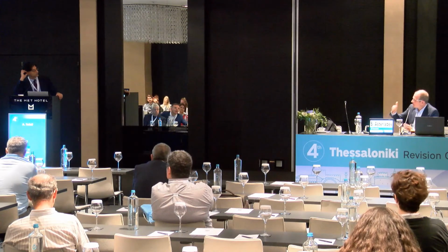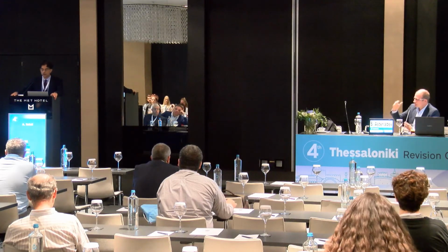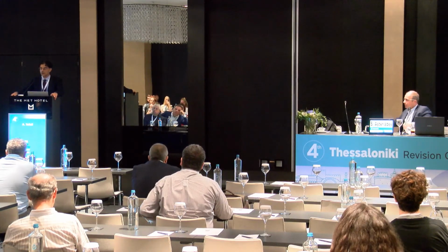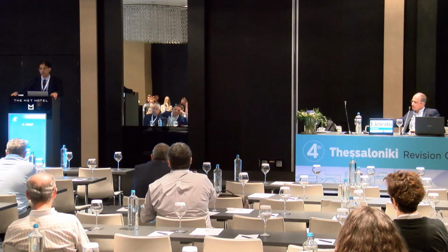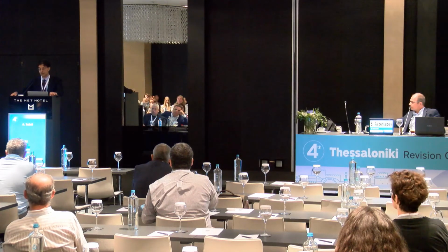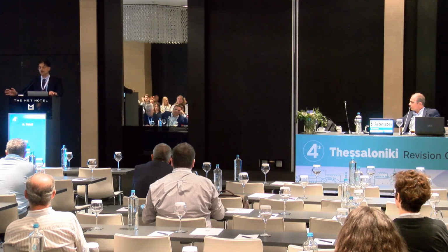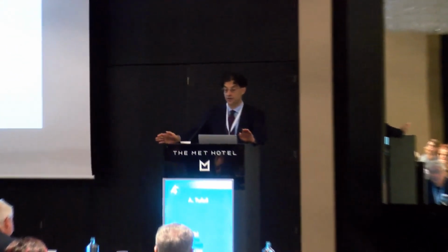So some tips out of the heart. So type 1, type 2, type 3, etc. Polyps. Okay, so first of all, imaging. High density raster OCT, you need to look at all the scans. You can't just have a printout and say, I'm not going to look at the rest of it. A bit of discipline. If anything's unusual, if the vision and the OCT are discordant, you may need to consider extra imaging. In terms of type 1 and type 2 CNV, less important for AMD in terms of treatment.